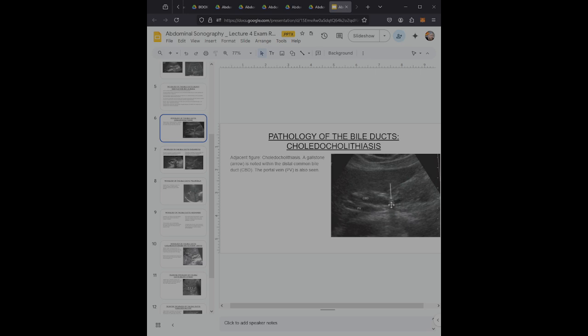One of the uncommon manifestations of choledocholithiasis is Mirizzi syndrome, a clinical condition in which patients present with jaundice, pain, and fever secondary to a large stone in the cystic duct, together with subsequent compression of the common duct. The sonographic findings and symptoms may appear much like those found with cholecystitis, and Mirizzi syndrome may be suspected, but it is typically diagnosed by cholangiography.